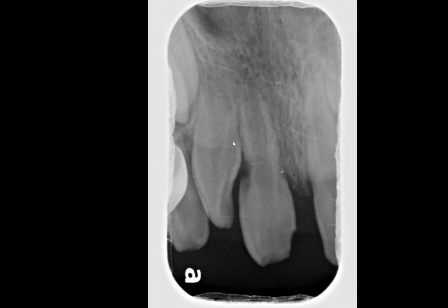Another thing, however, we note is that during that 7-month period, there has been a significant amount of cervical resorption that occurred at the distal aspect. Additionally, looking at the mesial surface of the root, it's irregular, suggesting that there is resorption at the mesial aspect as well.